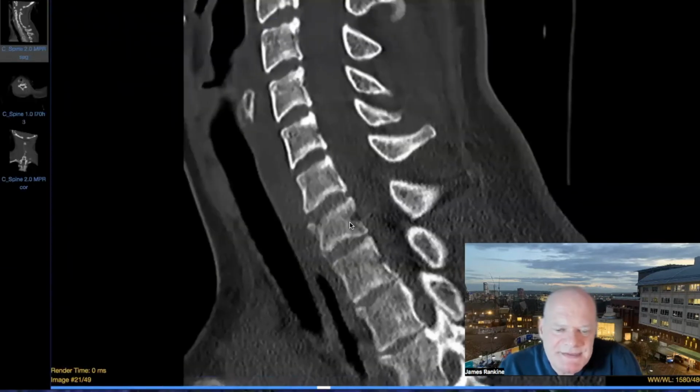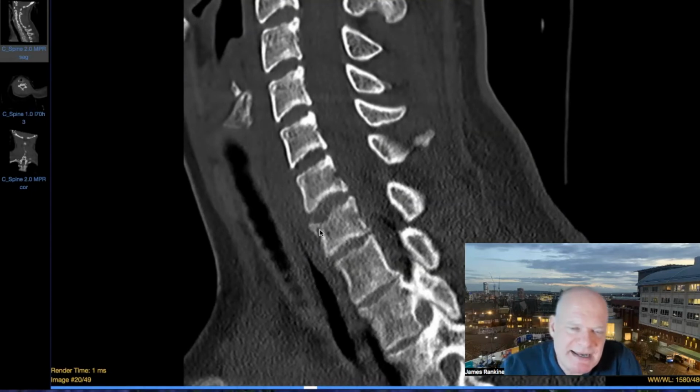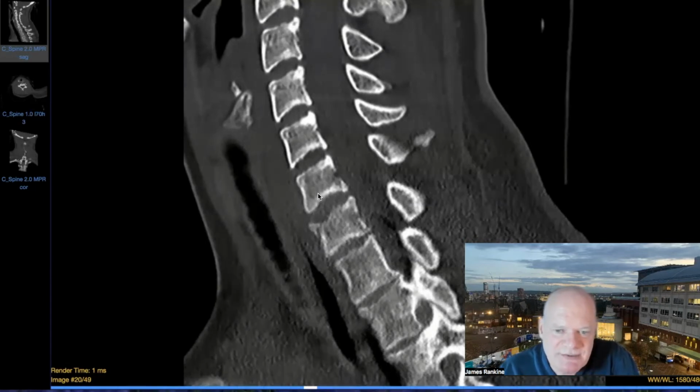So here, this is case 5, and here we've got a teardrop which is at the front of the spine with the orientation running longitudinally. So this has quite a characteristic appearance of a flexion teardrop injury. Now, unlike the previous one, the position that the spine must have been in for this part of the spine to come down, make contact with this anterior part and cleave it off, you can imagine what position the spine had to be in, the degree of flexion.